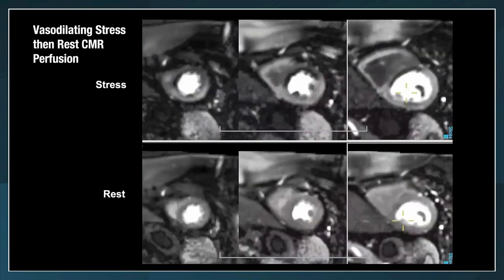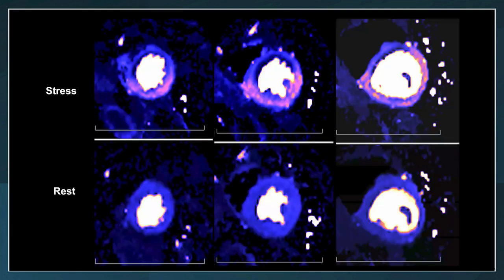Now, what is not so obvious is that when we use myocardial perfusion mapping, you can learn additional information as well. Not only did it show the hypoperfused area I demonstrated in the last slide, you can see that there's an additional perfusion defect in the inferior wall, as demonstrated in the mid-inferior wall here and the basal inferior infraseptal wall here.